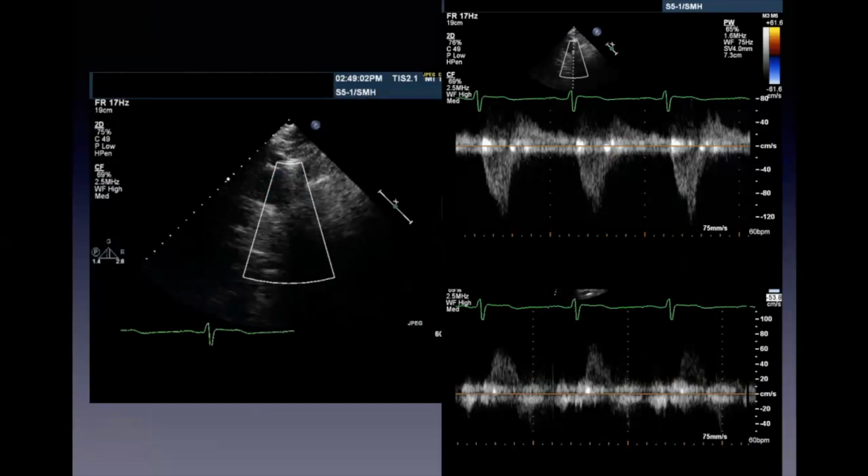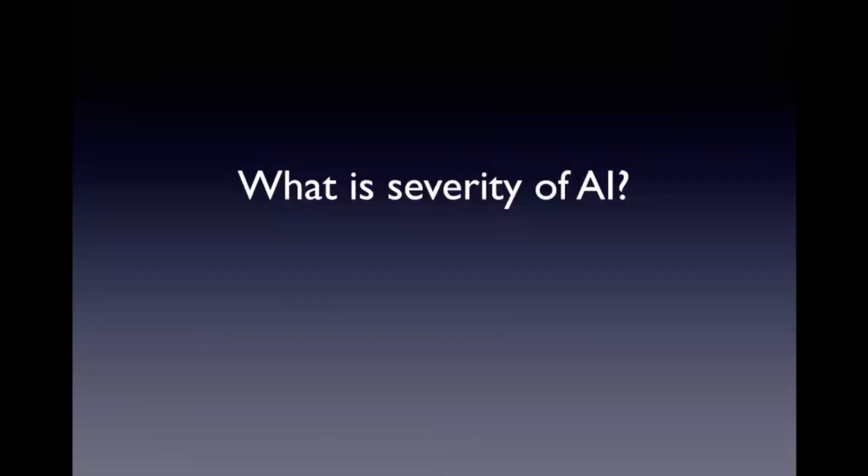It was, I think, in the low 50s. So here there's probably less holodiastolic flow reversal in the descending thoracic aorta compared to before, and not really in the abdomen. So same questions as before. Not sure for further ahead. It looks more severe visually from a color Doppler standpoint. So maybe at the very least, I think moderate to severe is pretty safe.